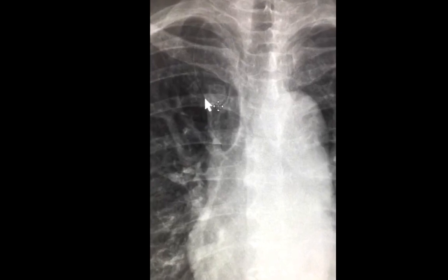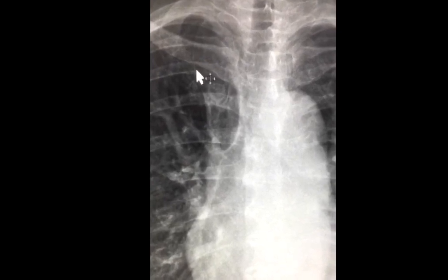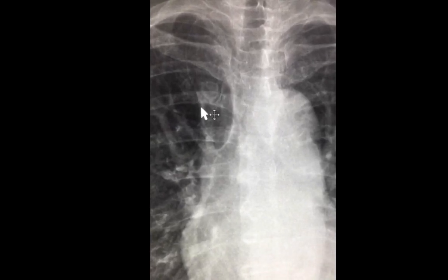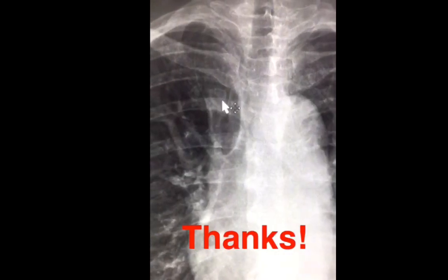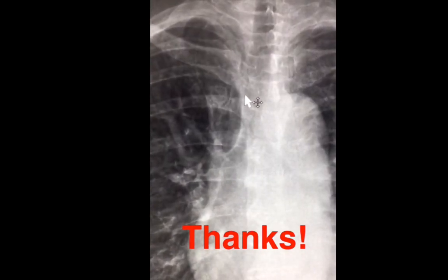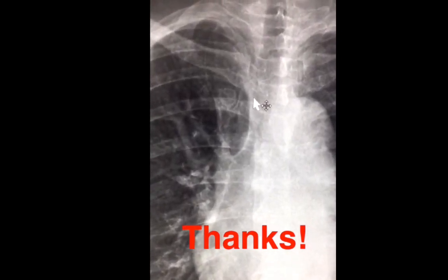So we learned from such cases that an accessory azygos fissure may be seen in some patients. The azygos vein may simulate a nodule if it did not completely descend, and the azygos lobe, which is not a true lobe, may appear normally or abnormally opaque, something that needs to be correlated clinically.